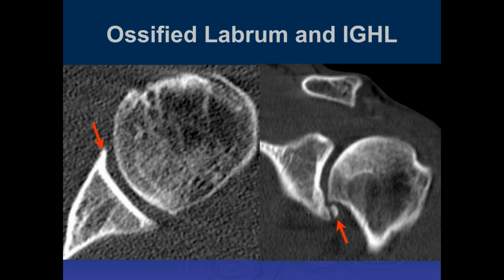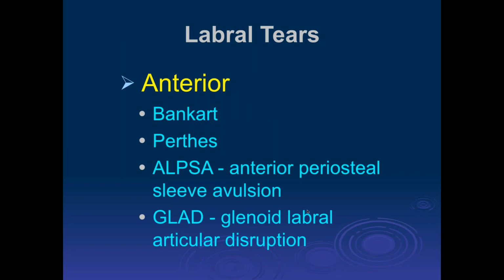So it's ossification, right? Is it symptomatic? Well, it's an indication of long-standing degenerative disease of the labrum, and I think it's important to point out because it indicates that there's degenerative disease, to the surgeons. Yeah.